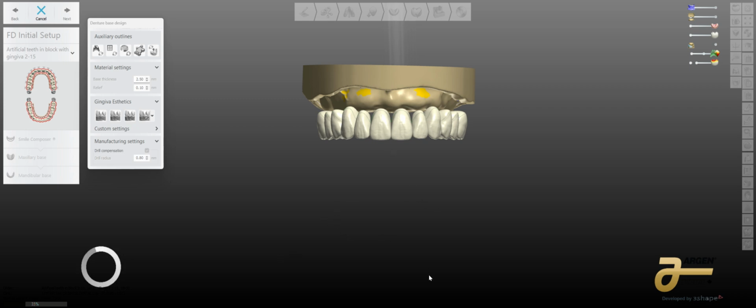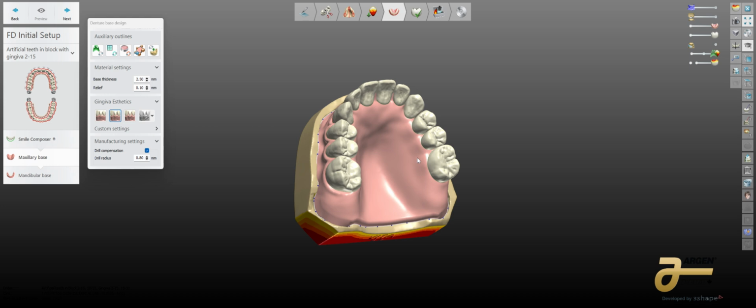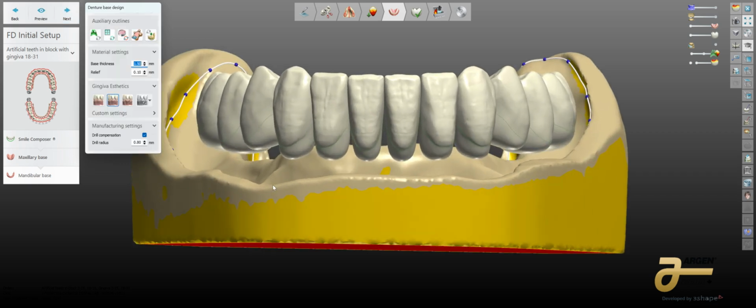When you don't move teeth around, when the contact points of the library are optimized, when you're volumetrically changing all the teeth at one time, it's going to be rather easy for the gingival preview produced in this fashion to be rather good. You're going to see rather quickly how this produces. It takes a little bit of time for this aspect, but I haven't touched this at all, and it's pretty decent. I'm going to show you what I do here, but let's click forward and say that that's okay. And we're going to do the same thing for the lower.